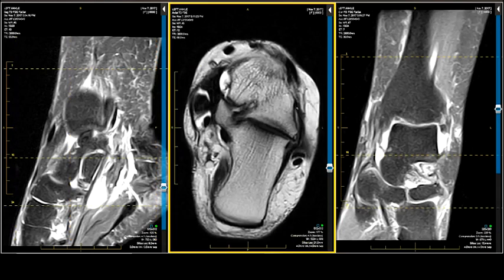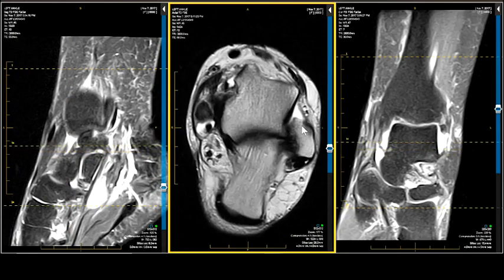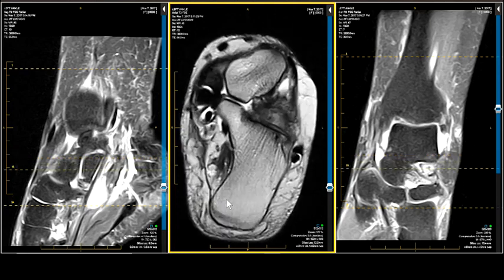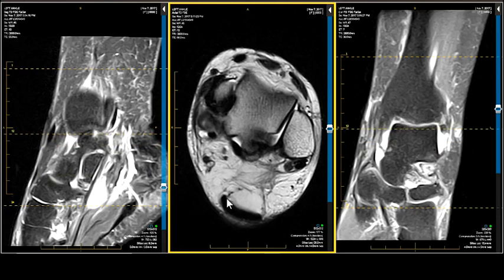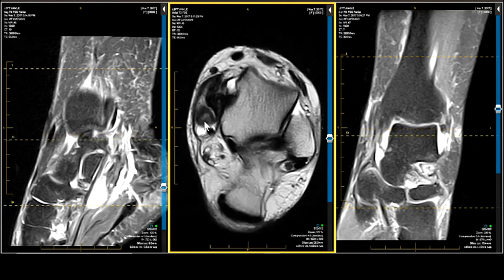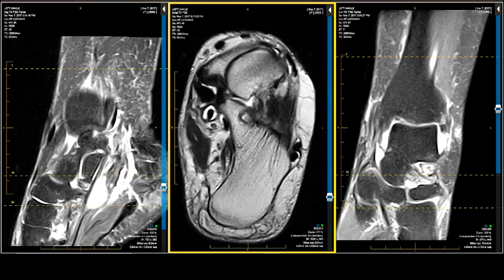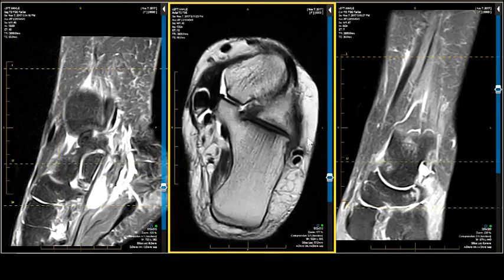So we're not going to be honing in on the anterior talofibular ligament, which is normal, nor are we honing in on the intact, well-seen calcaneofibular ligament. 2, 3, 4, 1. They're all present. They're not necessarily normal, but they're present. For instance, there's severe hypertrophic tendinopathy and interstitial chronic tear of the supramalleolar posterior tibial tendon. There's peritendinitis. There's some peritendinitis around the lateral group, too.